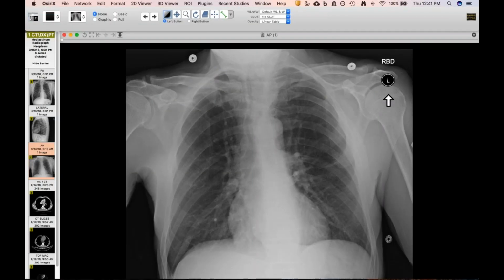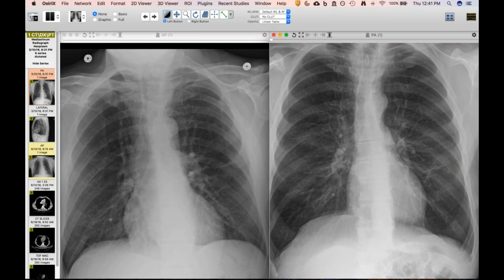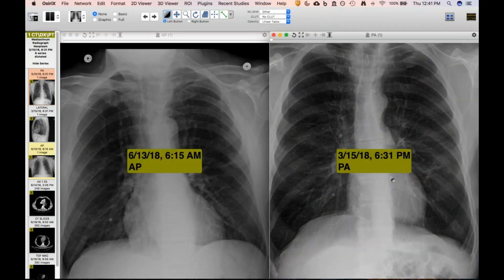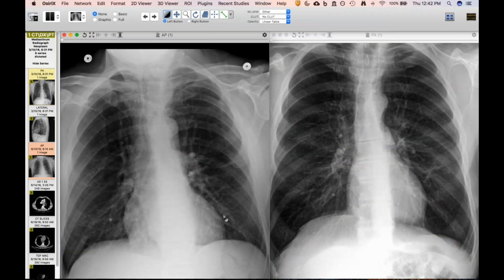So the next one, this is kind of interesting. I saw this at the VA a few weeks ago, and finally have an answer now, which is why I saved it. And this is the old radiograph here, and it's only 3 months old, but it's interesting because, of course, I find that all retrocardiac stuff, our residents struggle with at first until you can get them to look there.